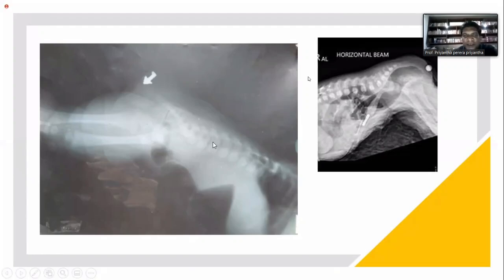Why do you want to differentiate the two conditions? Management is different. Yeah, surgery management is different. Good. What is the difference? In this one, only a small distance is missing, right? And you might even do it in a single stage operation. A single stage operation can correct the defect. Here, the defect is very long, so you can't correct it by a single operation. You better do it stepwise, with multiple surgeries to correct it ultimately, right?